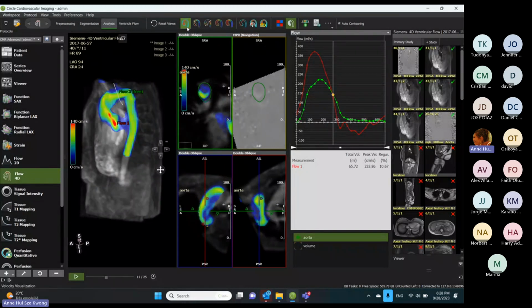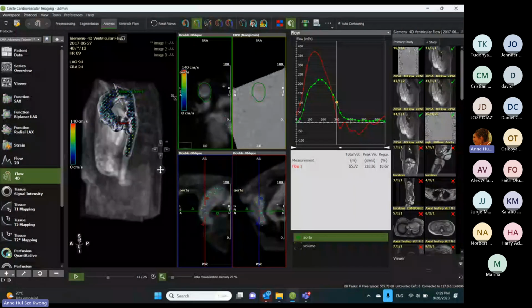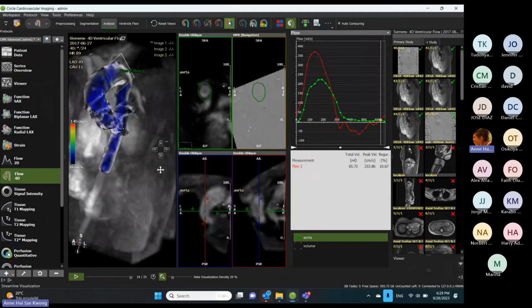First, this is a simple velocity. Then you have the vectors, okay? And this, you could say some video, etc. Pathline per plane, it's just you can see what's going in and out of the saved plane. Then you see that every time you let the mouse hover, you have the definition of the tool as it is for our software. Pathline and streamline. So streamline is, let's say, the most common use because you can see easily the turbulences.